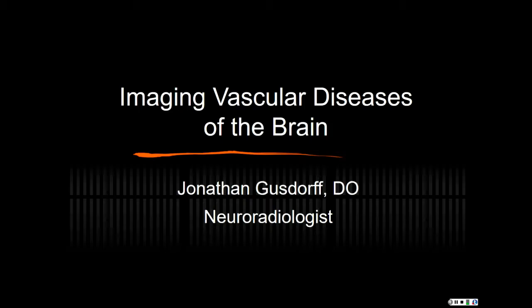There's another point that I don't think I made that I want to make sure is very clear to you guys. If you see a lesion on diffusion-weighted imaging that is bright, there is another sequence that is obtained at the same time that DWI, or diffusion-weighted imaging, images are produced. Those are called ADC maps, apparent diffusion coefficient maps. There are many things that can be bright on diffusion-weighted imaging. There are areas of chronic ischemia that might be bright on diffusion-weighted imaging. Well, then what's the use of DWI if I don't know if it's acute or chronic?